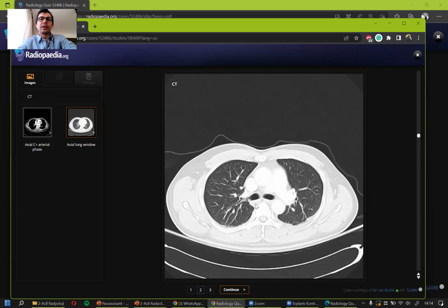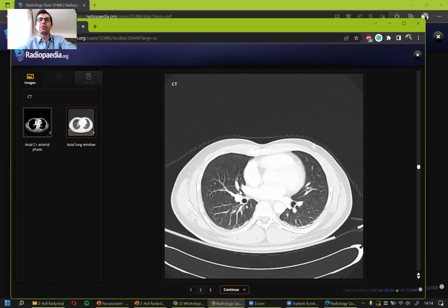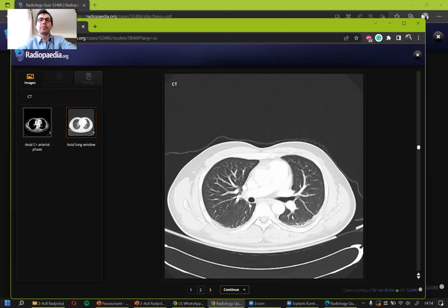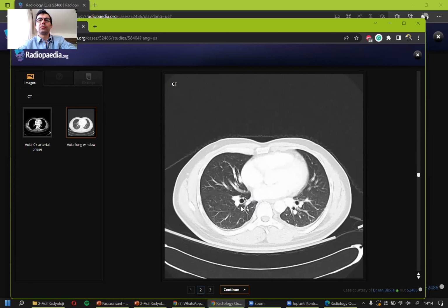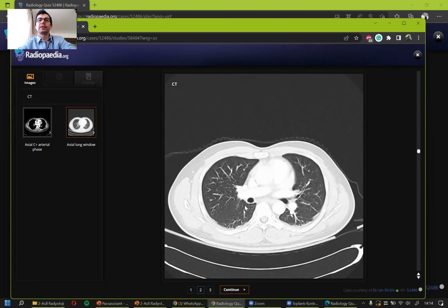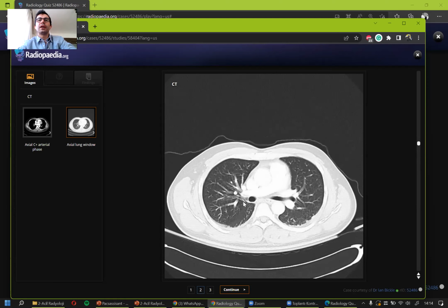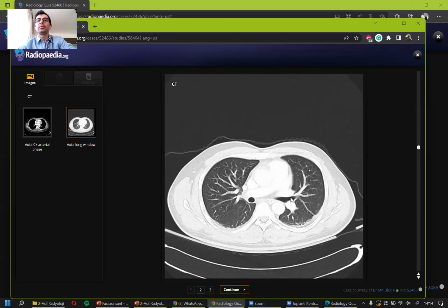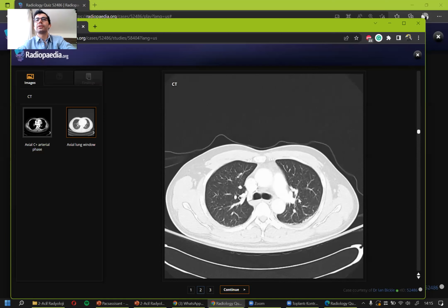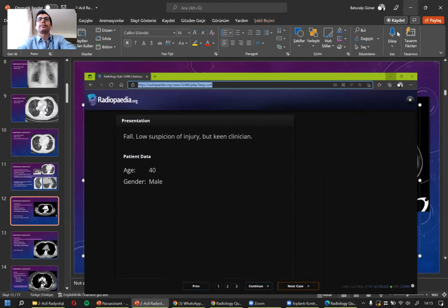Let's check it out. First, I saw the upper lobe on the right side. Then I see the middle lobe. And on the bottom, I saw the lower lobe. The lower part has a superior segment as well. On the left side, I'm seeing the upper lobe, which is this one, and I'm seeing the lower lobe here. The upper lobe has a lateral side and some branch which is going to the top as well. Okay, what else should we see? Let's check.